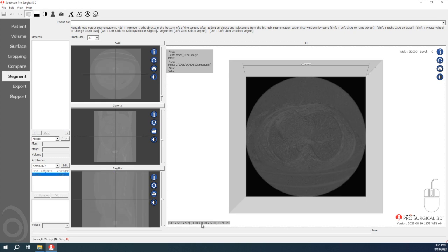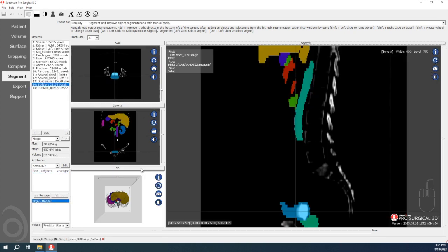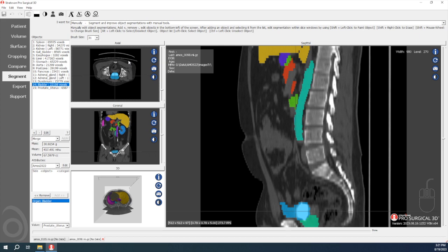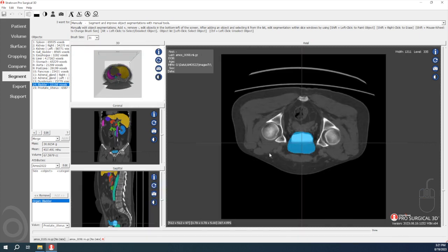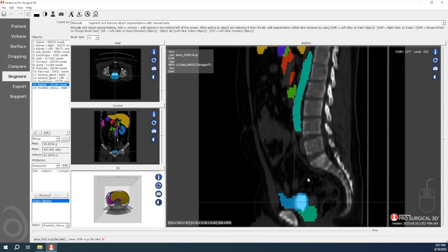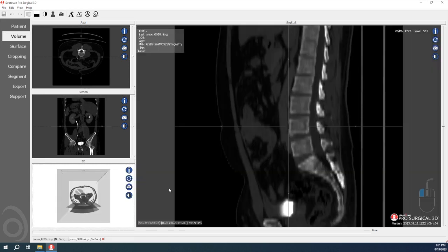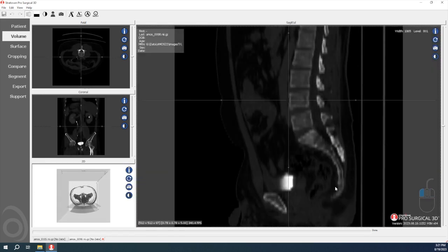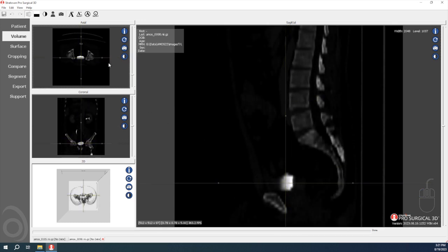Flatter here is significantly different. So there's a bright spot here, which is impacting this particular one. So perhaps that's a tumor or something else that's in there. I'm not really sure. Again, an expert would have to review that to determine if there's any particular problems there. Could also be contrast dye perhaps, or something that was used during the scan. Not sure.